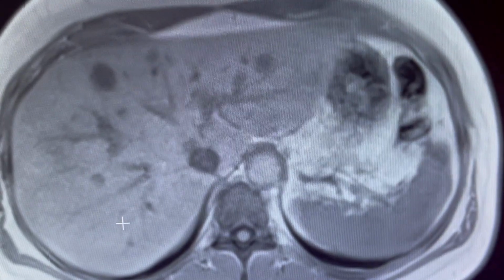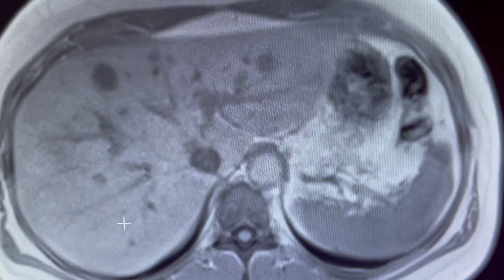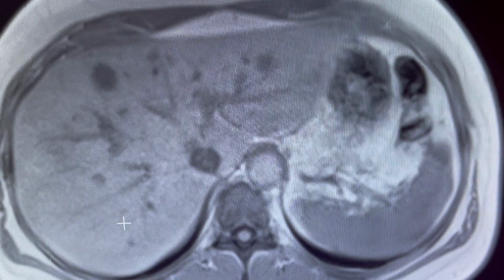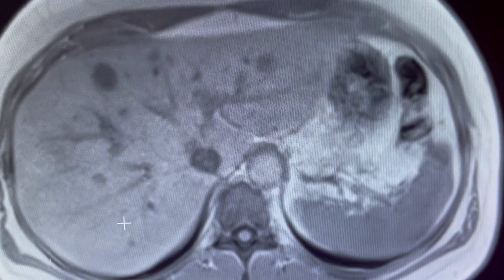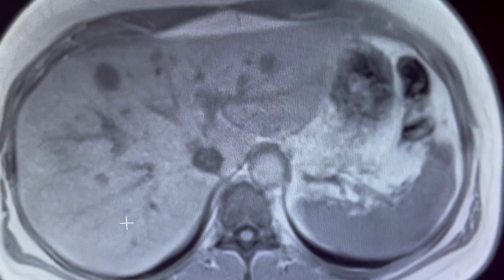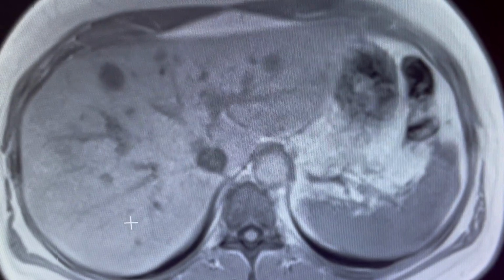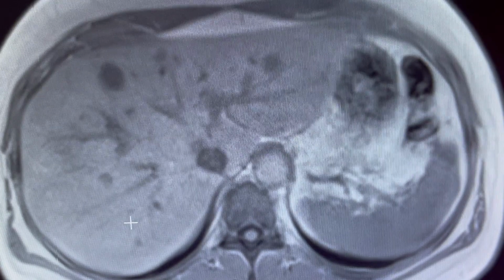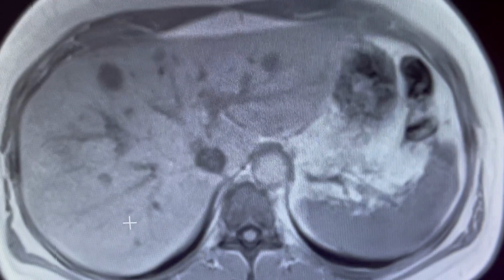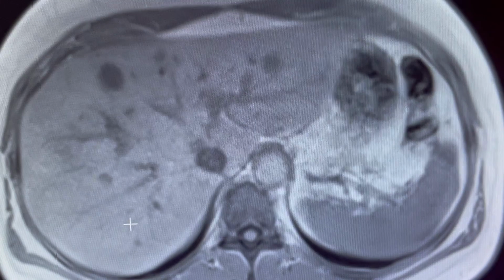This is Richard Semelka. I am going to show you today an extremely fascinating case, and I'm going to describe the findings as we go along so you actually see how I evaluate MRI of the abdomen, which is something that perhaps arguably I'm the world authority on. And some of these things I'm just going to have to jump through too quickly because I'm trying to illustrate to you a very complicated case.